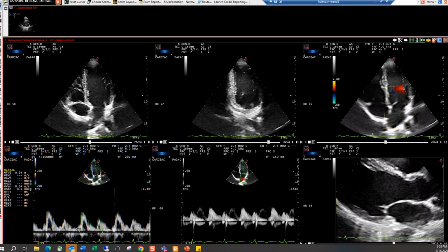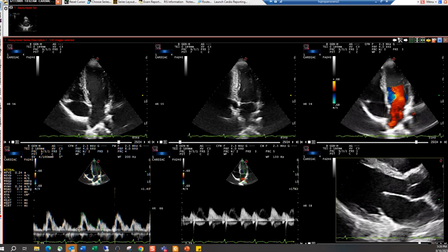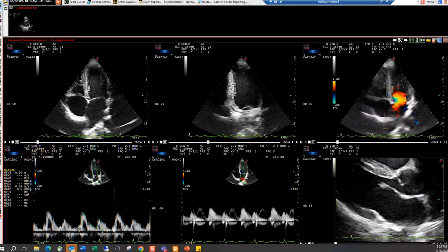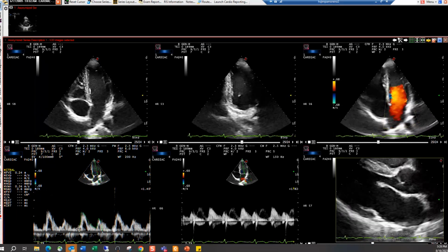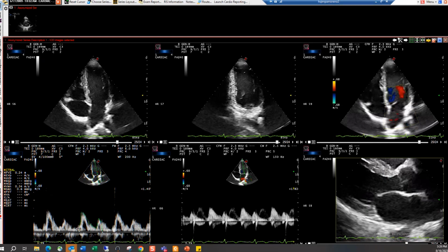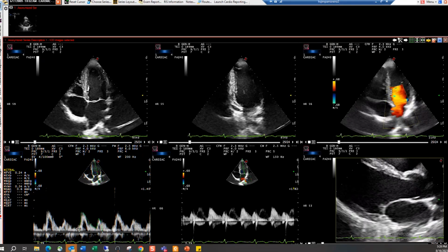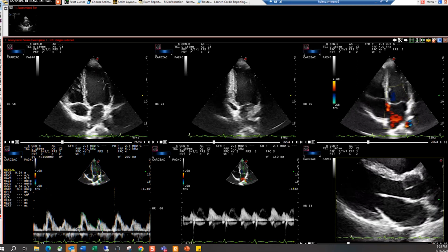As the images flow into Encapture MD, it will populate those fields, and then sentences start to develop, which you will see when Dr. Scott shows you that. Once that's done, the cardiologist can go in there. He's able to put in the abnormals, click all else normal, and pretty much the report is generated in a very short time frame. That also works the same way for the sonographer.